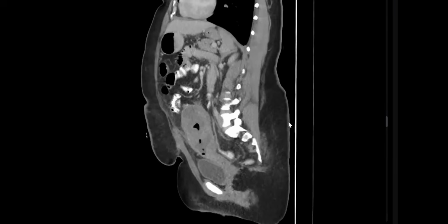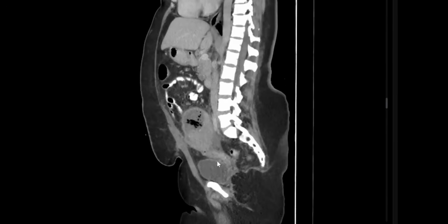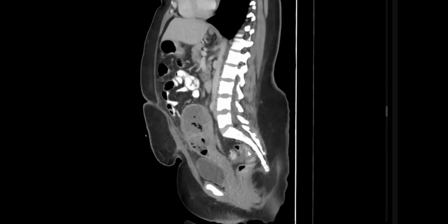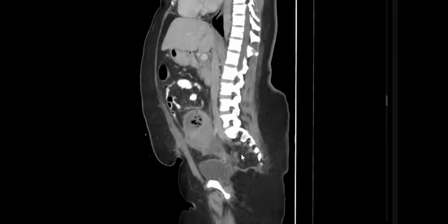Okay, sir. So in sagittal, we can see if there is any communication between the uterus and the bladder or any fistulous formation between the anterior or posterior structures like the rectum or the bladder. Most commonly post C-section, there can be a rent or a giveaway at the anterior uterine wall. A communication can form between the uterus and the anterior abdominal wall. Another value will be seen on the next case.